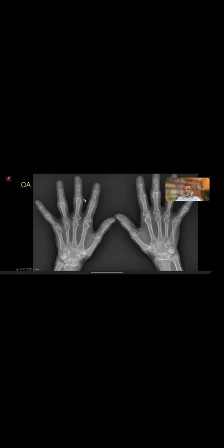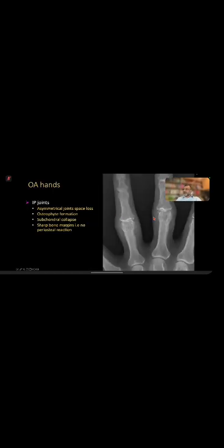It's quite asymmetrical within the joint, which is a hallmark of osteoarthritis. Of course, there is some soft tissue swelling and marginal osteophytosis there. This is a very typical appearance. So what you see is asymmetrical joint space loss, osteophyte formation, which is again asymmetrical, and subchondral cyst formation. I'll show you another example in a second.